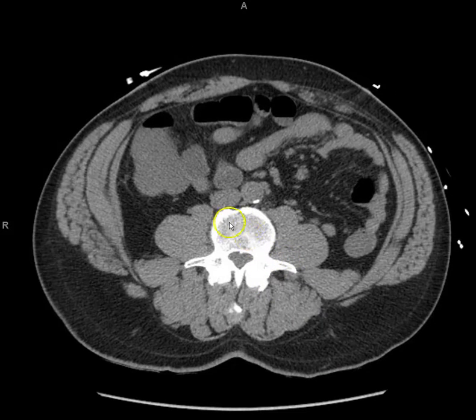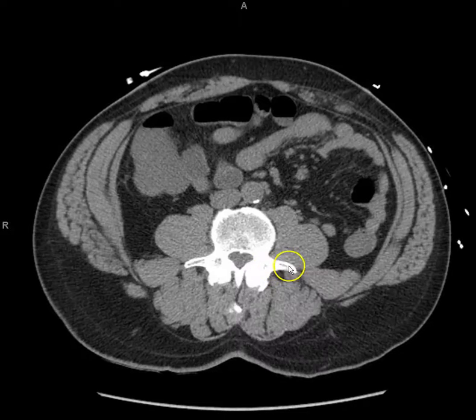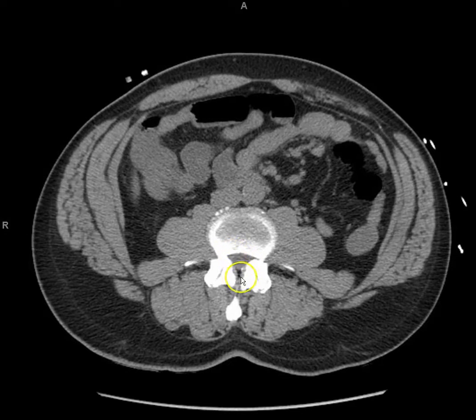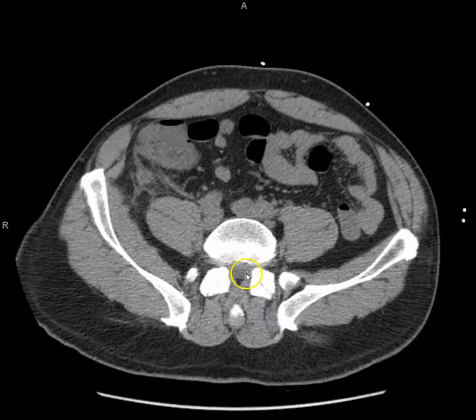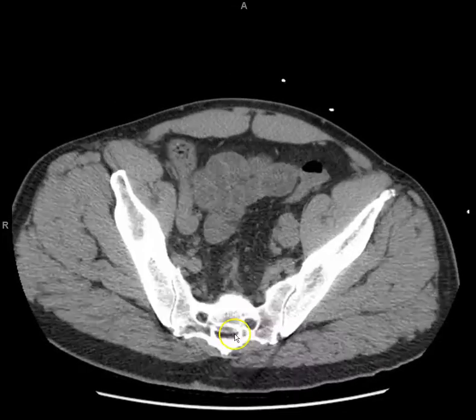So you're behind. This is the vertebral body of the lumbar spine. This is the spinous process. There's your transverse processes. James, do you think you can back him up? You feel comfortable? Yeah, I can do that. This is the spinal canal. You've got vertebral column right here. So your spinal cord is right here. And if you go way down to the sacrum, you see it splits into the cauda equina and stuff.